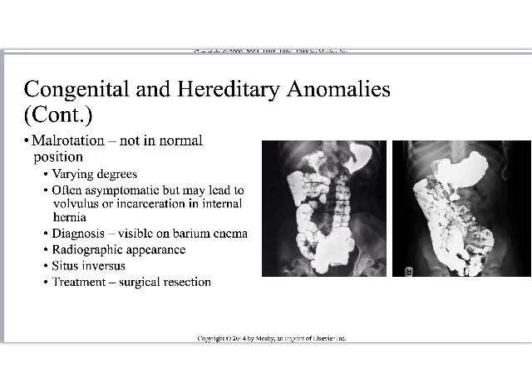So very important that we're doing BEs on stuff like this, right? And in fact, the BE might be used to slightly twist things around. They might see if they can press on the patient and move the stuff around a little bit. It has this radiographic appearance in that the stuff's just not where it should be.